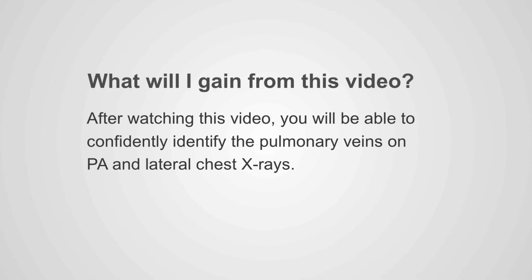What will I gain from this video? After watching this video, you'll be able to confidently identify the pulmonary veins on PA and lateral chest x-rays.